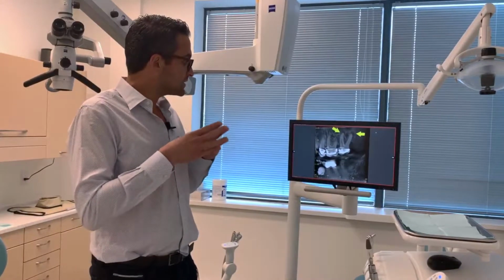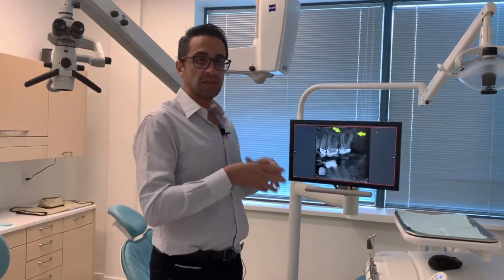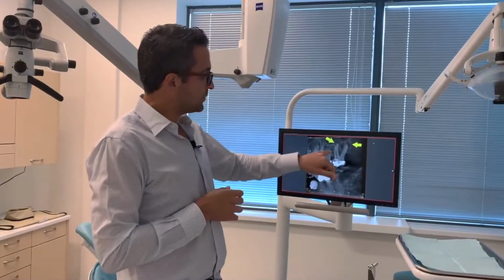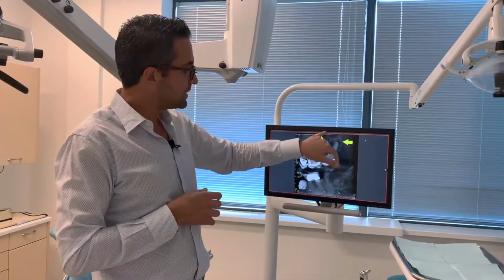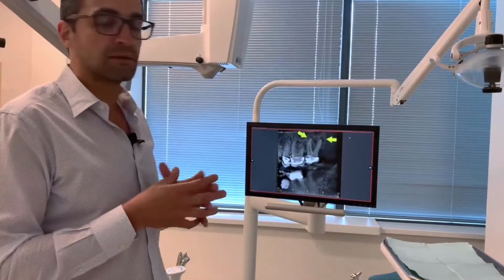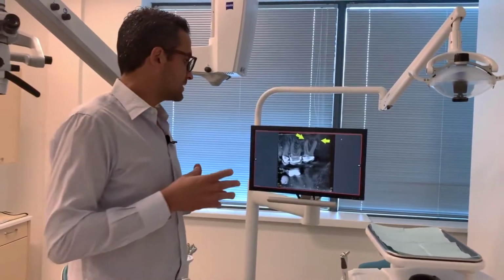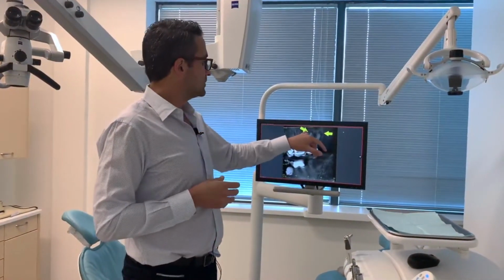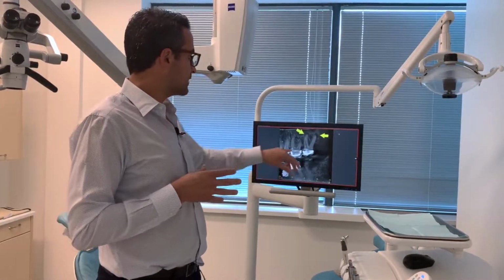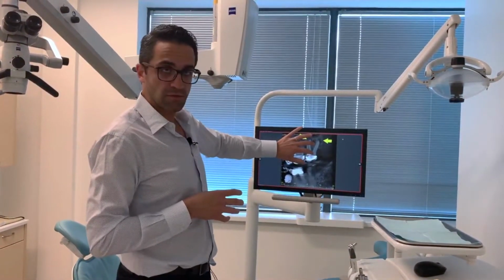On the CBCT, I was able to directly diagnose the tooth that was really problematic or painful, which is the last molar, as we can see here. We can see the two arrows pointing at what I call Mickey Mouse ears, these two big black bubbles around the tooth, which signifies that this is the tooth that is infected. This is why the patient is in pain. And there were no other lesions or black bubbles or circles around any other teeth in the area. So I was really able to say that this is the problematic tooth.